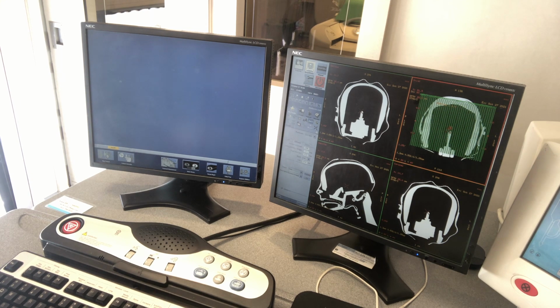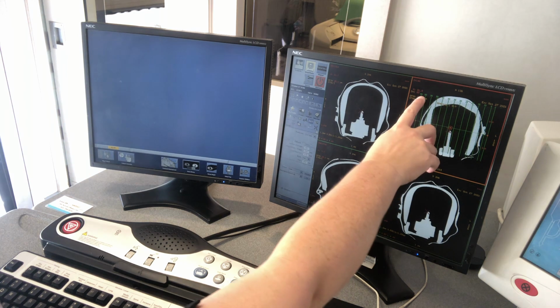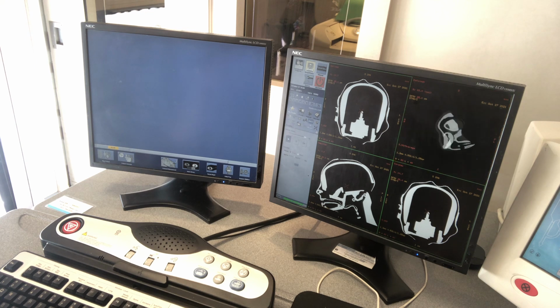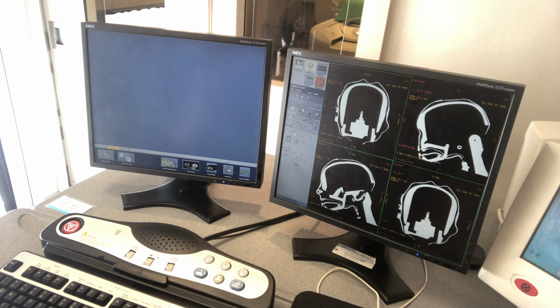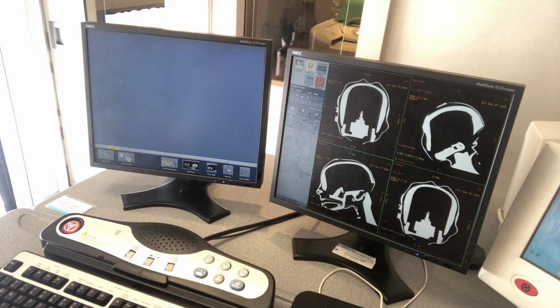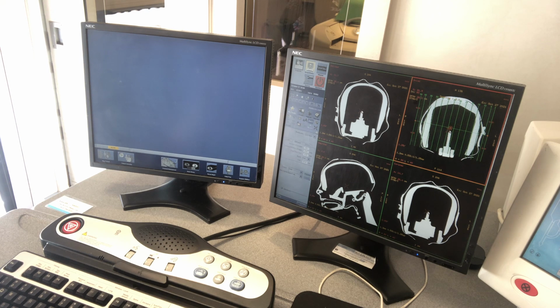Change the space between images and the slice thickness to 3s. And if you ever have any questions of what to recon down, the protocol book is in here. Just look it up and it'll tell you. I'll rename them to sagittals. Change the field of view to 25. And we're going to hit preview. Scrolls through, so then we can hit close and OK.